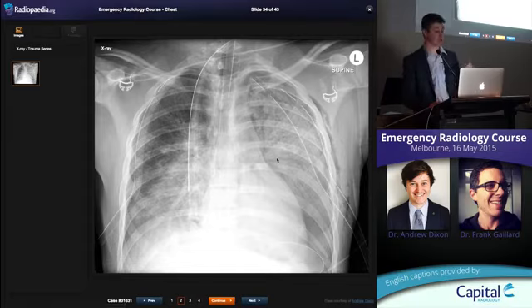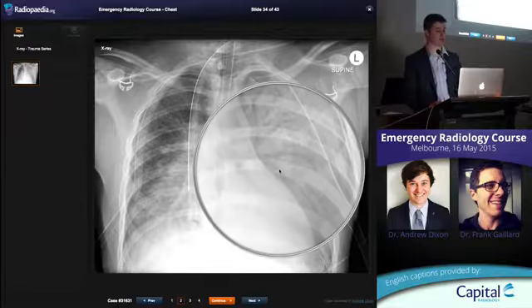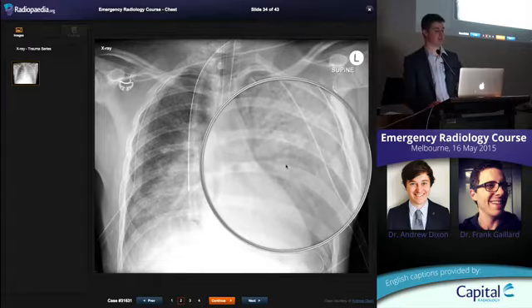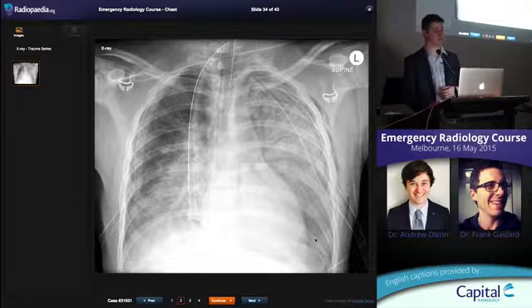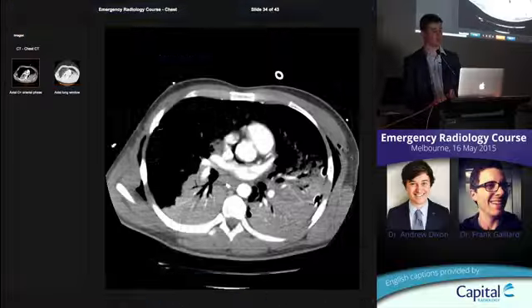Here's a nice example from my trauma course. Beautiful air bronchograms. These are the best air bronchograms you'll ever see. Look at that. So in a trauma patient, you might look at this and go, oh, they've got a massive hemothorax on this side because they've got heaps of opacity, but it's not. This is alveolar. This is hemorrhage within the lung. Okay. Down in the base here, see how it's more lucent? Down here, can't see that recess. It's all deepened. That's a deep sulcus sign of a supine pneumothorax.